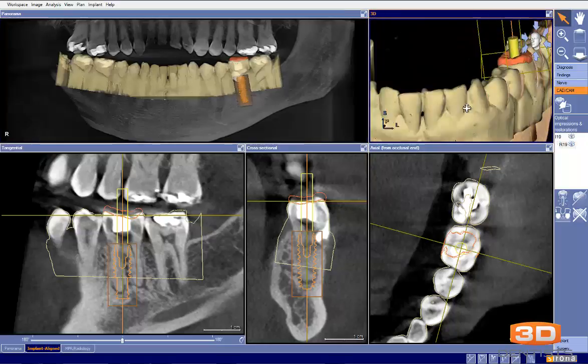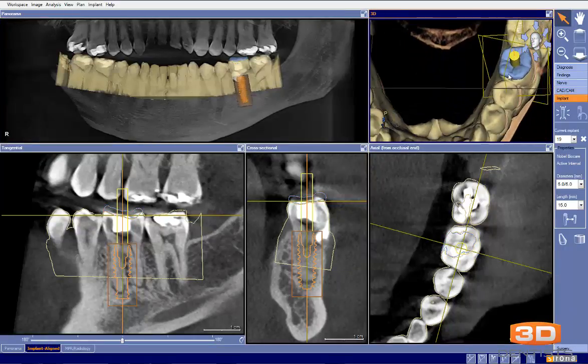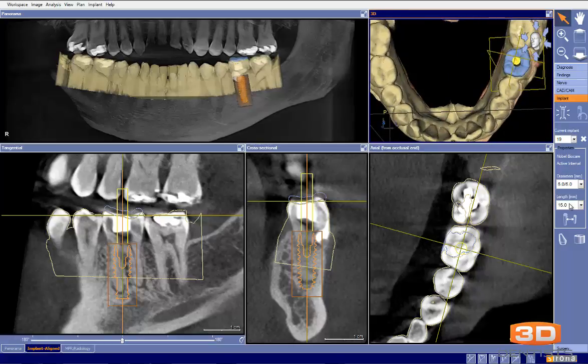So in looking at this, my initial first concern in this particular case is two things. One, the length of the implant that's used. Not that there's anything wrong with a 15 millimeter implant. I just get concerned from experience that very few patients are able to open up wide enough to allow us to get a guided 15 millimeter implant in.